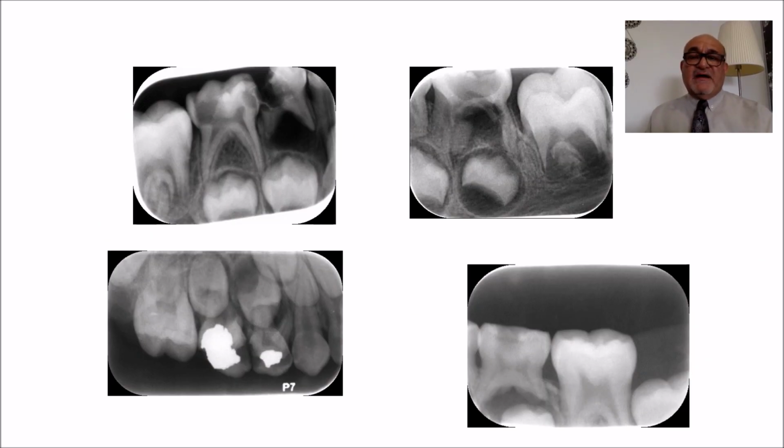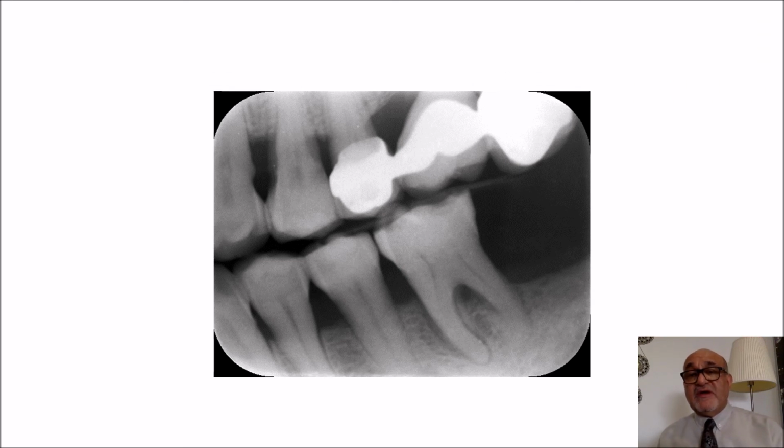Okay, and I will leave these radiographs for you for further exercise. I hope I made my point clear in the direction of how to locate whether this is the maxilla or the mandible. Then you are going to have a look at the radiographs that you will have, and please follow the following: locate maxilla or mandible, locate midline, draw an arrow from midline posteriorly and see where this line extends.